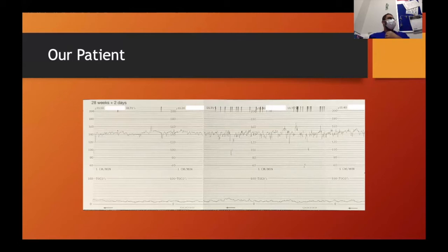What if she doesn't have any previous traces? How do we assess? Low risk woman who's just come, antenatal notes, fetal heart rate. So fetal heart rate in antenatal clinic is not helpful. Okay, you miss a big, big opportunity to figure out what your norm for this baby is, because then you're just going with a generic, this is what fetal heart rates at 40 weeks are supposed to be. Does that make sense?